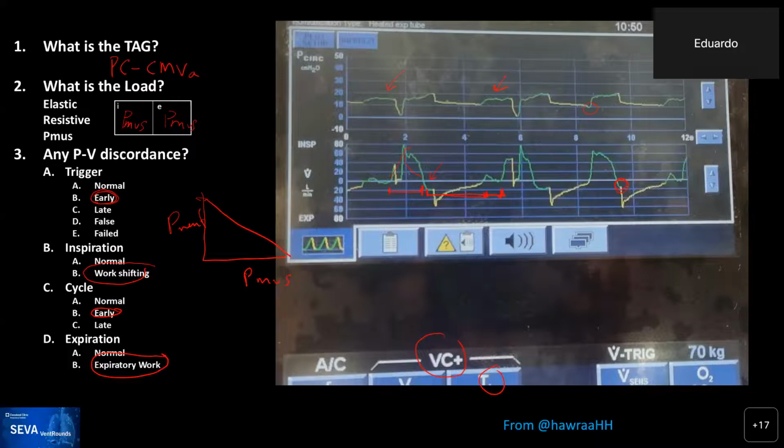So what I hear is, first, all the breaths initially were like the third one, so I decreased the I time. Then I got this image. Yeah, so I mean, the patient is reverse triggering, and so probably, yeah, excellent, Hara. So Hara decreased the respiratory rate, and that's probably my first move whenever I see early trigger, is to decrease it and see if it continues.